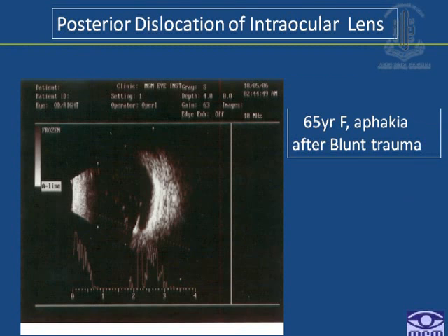Another picture showing a saucer-shaped lesion, a typical saucer-shaped lesion in a 65 year old female who became aphakic after a blunt trauma. We did an ultrasound just for academic reasons, and we found that this is definitely an intraocular lens which has gone inside the vitreous cavity.